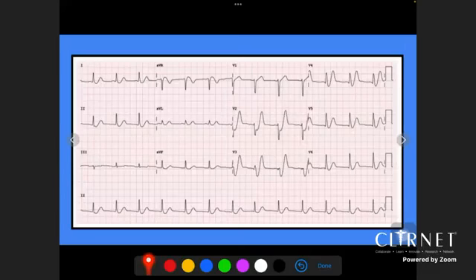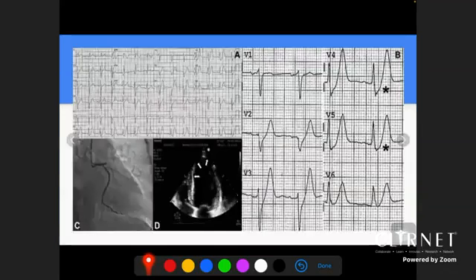So this is an example of the De Winter T waves. You can see here in the V leads, focus on V2, V3. However, it can be present in all the V leads. There is upsloping ST depression here and hyperacute T waves, indicating De Winter syndrome, which is acute LAD occlusion.